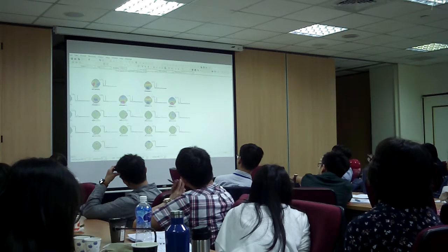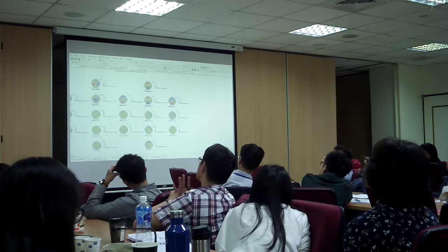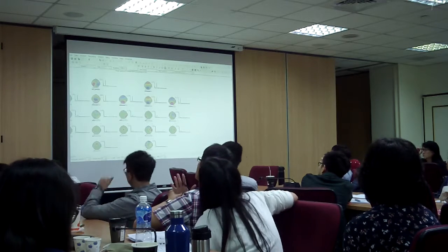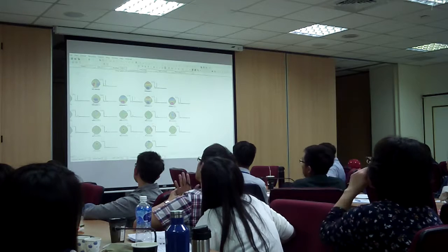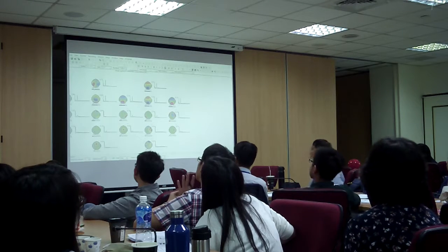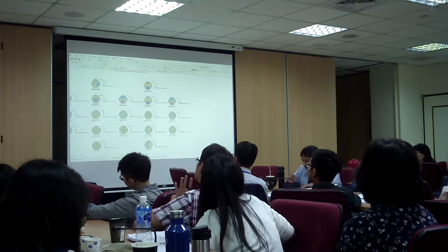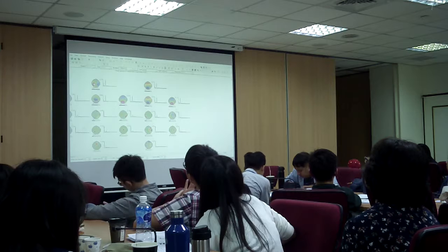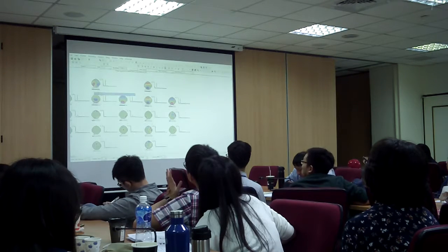I'm going to do something called Loreta, which is low resolution tomography. It's an MRI for poor people, pretty much, because we cannot afford to pay for an MRI machine. So we're going to do Loreta, which is the next best thing. So I'm going to right click, and I'm going to go Loreta for components.